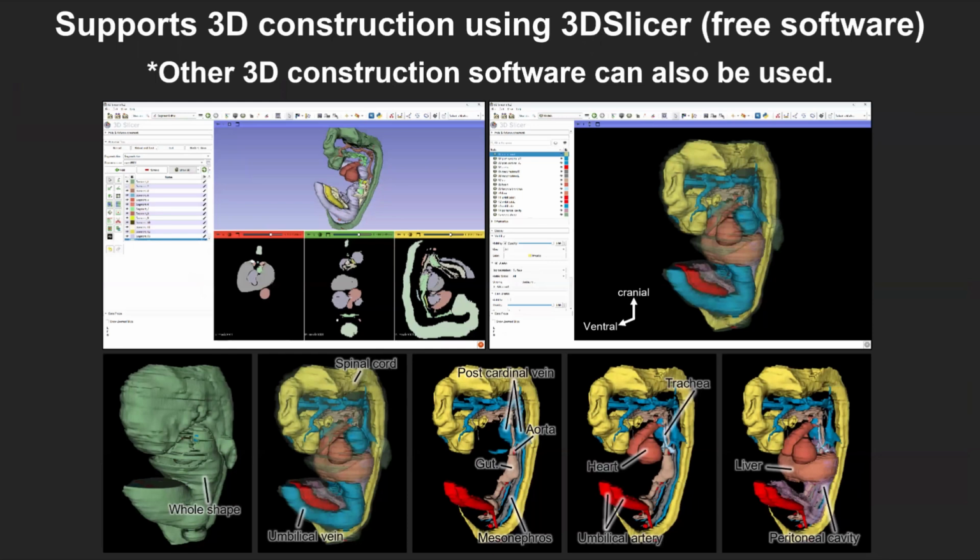The final segmentation data after this refinement process can be imported into 3D reconstruction software. 3D Slicer is a free software that is commonly used around the world as free 3D reconstruction software. The segmentation data exported by SegRef data can be easily imported to 3D Slicer.